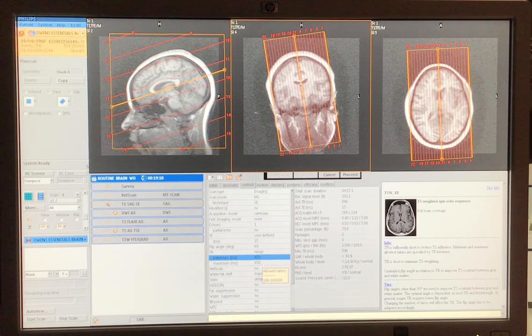Would that work? Yeah, that's going to give you low TR. If I go ahead and pick with my TE, I can say I want to use the shortest TE that I can. The shortest TE I can pick with all of these parameters I have with these slices up here is an 8. Over here it says 8. And does that give me T1?